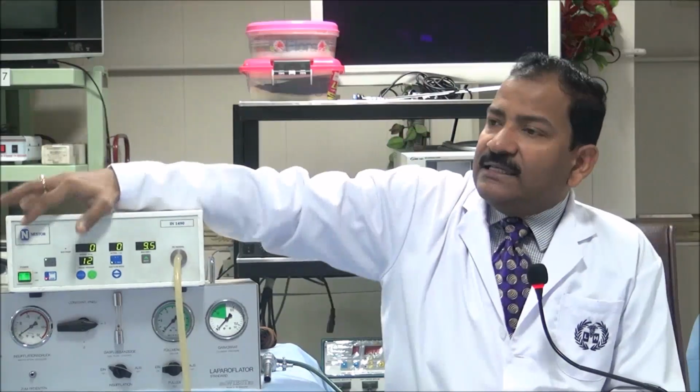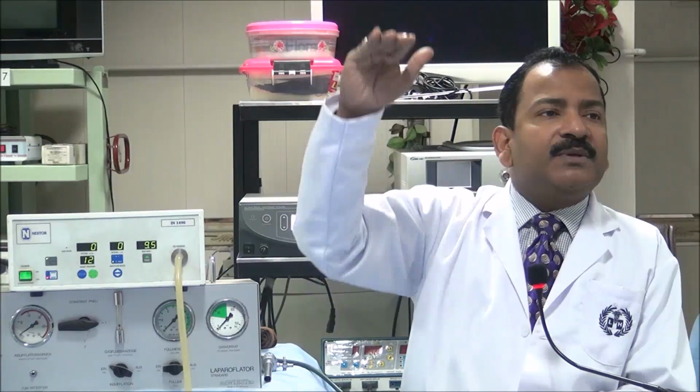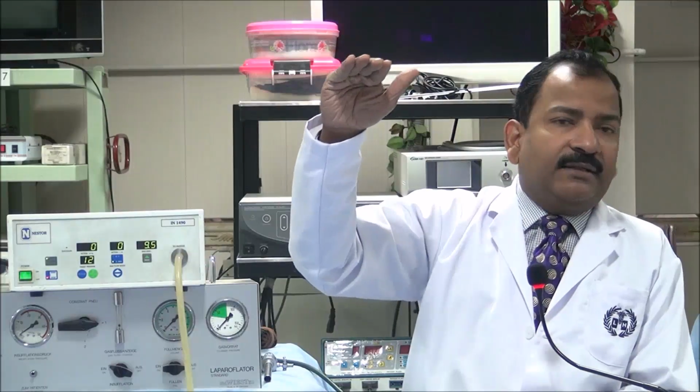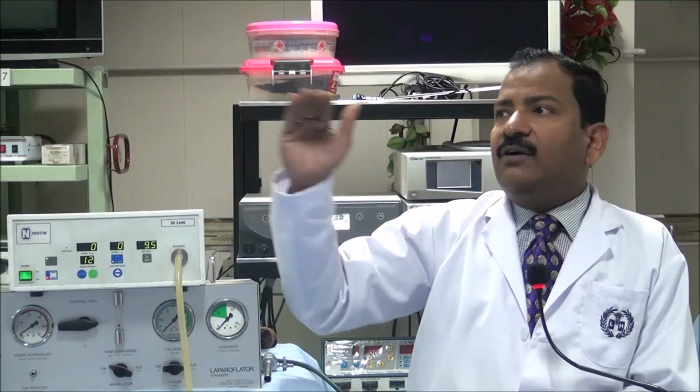After that, start the flow and bring it to 30. Once you bring it to 30, the mercury column of the BP instrument should go to 30. That means it is correct. If here it is showing 30 and the mercury column is showing 50, that means it has to be calibrated. It is dangerous. It can create a big problem.